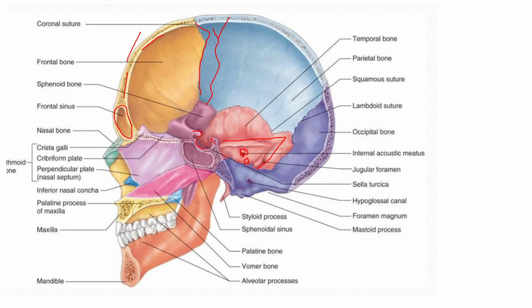Now the hypophyseal fossa. In body of sphenoid you will see this air filled area. This is sphenoidal air sinuses with multiple cells present, air cells present here.